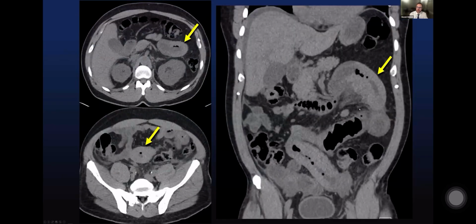This is a patient who has high attenuation bowel wall thickening in the proximal jejunum, again, higher than the skeletal muscle. This is a non-contrast CT, and this patient was anticoagulated. Notice this patient also has more bowel wall thickening in the pelvis, and this was spontaneous hemorrhage due to a supertherapeutic INR.